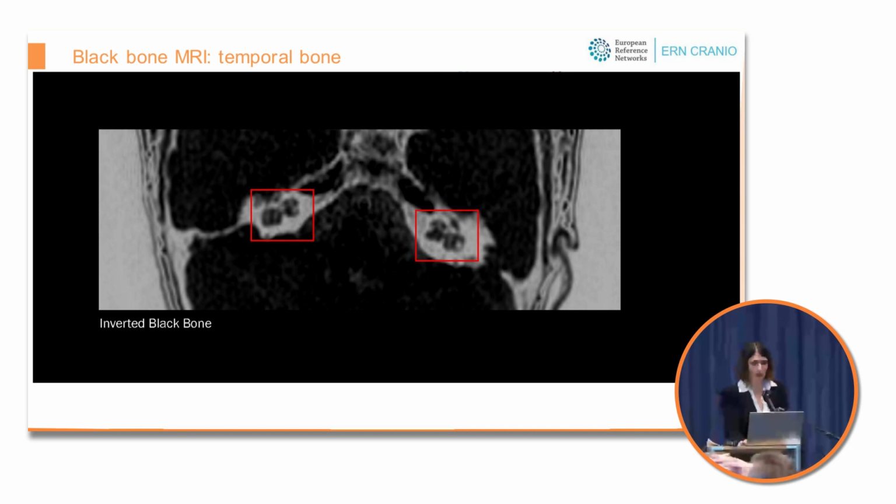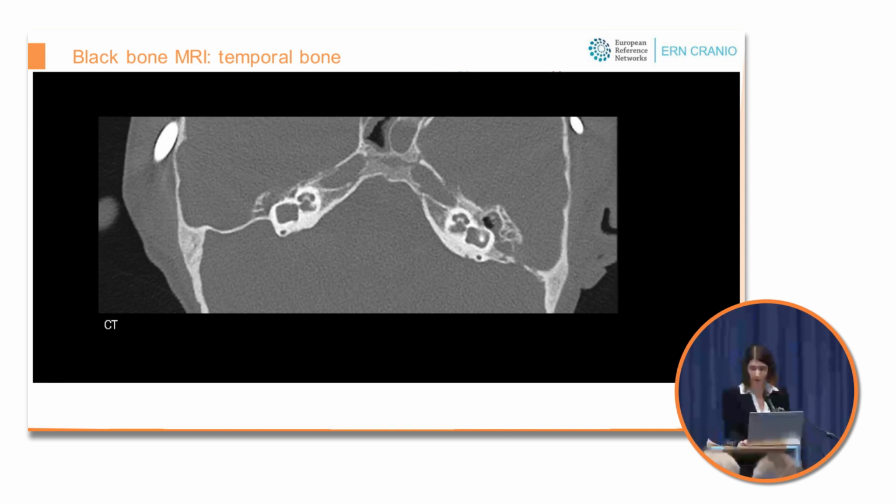This malformation has been anecdotally reported in literature in association with Apert syndrome and hearing loss. We found similar malformations of the vestibule and lateral semicircular canals in 5 out of 6 patients with Apert syndrome in our population. The posterior semicircular canals were normal, and the findings were confirmed on CT.